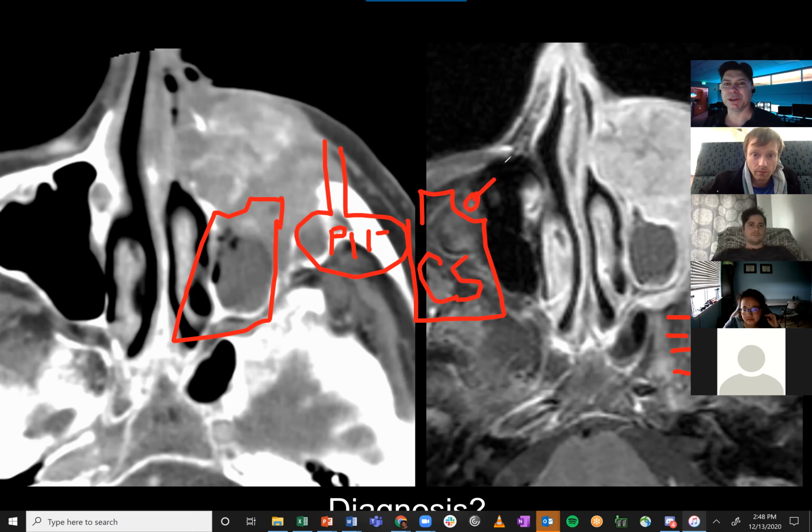You've got 3, superolateral. You have 4 just under it. And then V1 and V2 are going down the walls. And we think about 6 kind of being loose in those valveless sinusoids. They actually connect under the pituitary gland. So one cavernous sinus connects with the other under the pituitary gland. There's a dural venous sinus that goes under that at that location.